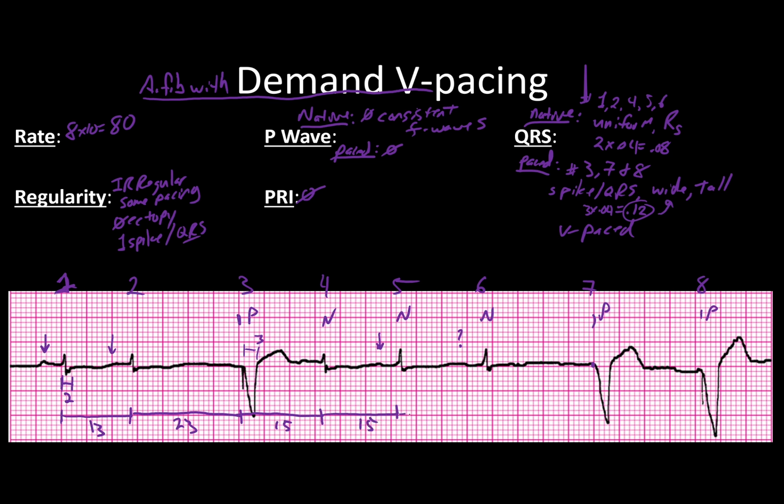And these aren't quite perfect, but they're enough that you can get the idea of what's going on here.